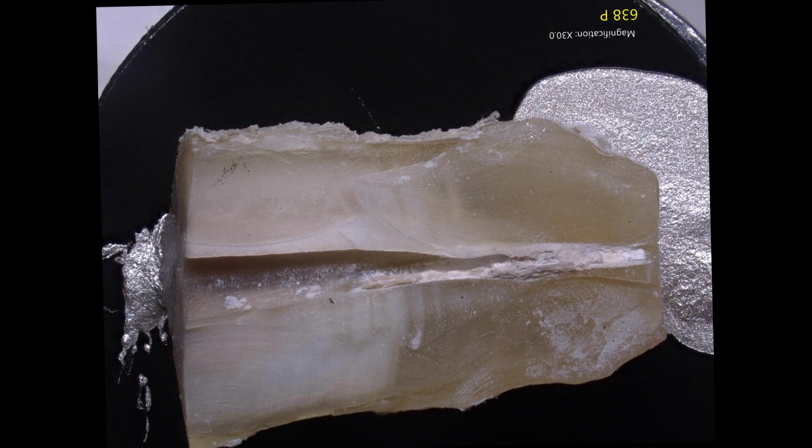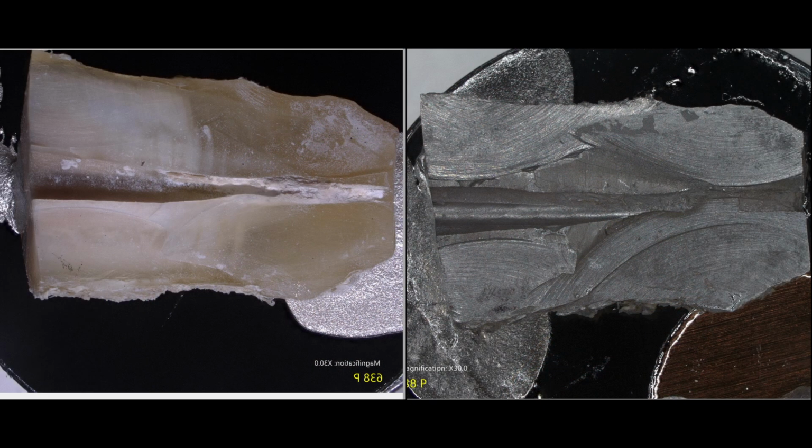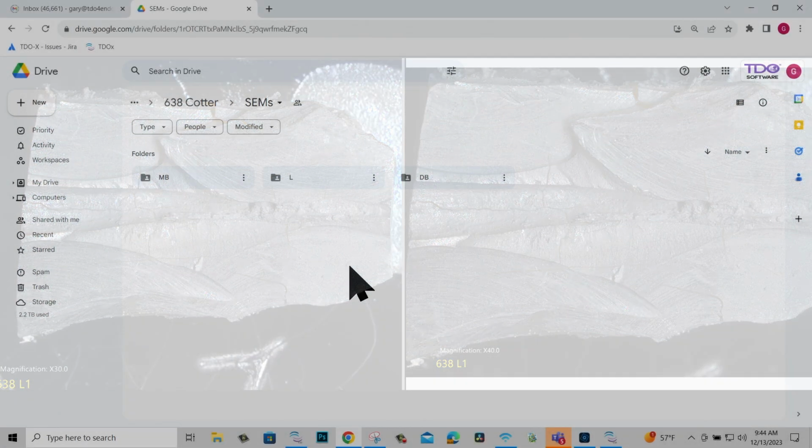So I don't know what kind of resorptive defect that was, but when I sectioned the root sagittally, it was filled with calcium hydroxide. So according to our method, I took a camel hair brush and tried to brush away a lot of the calcium hydroxide. That's what the sputter-coated section looked like. Some of the calcium hydroxide was able to be removed and some wasn't, so it really complicates the interpretation of the section.